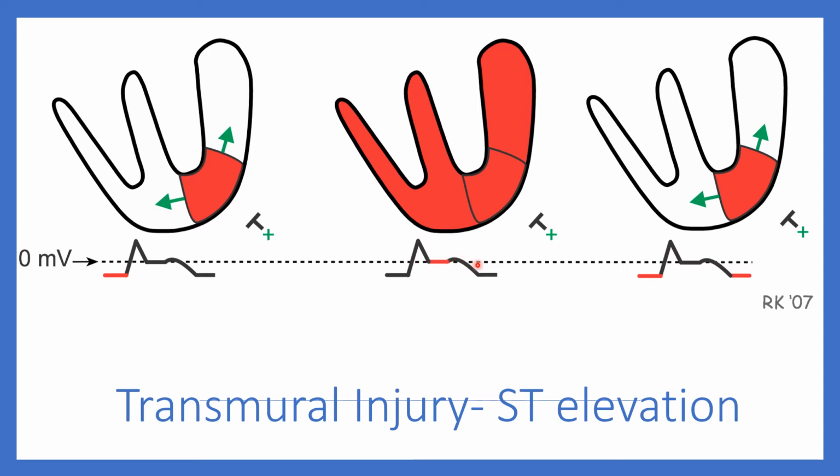When the repolarization is complete, you come back to the baseline, which is the PR segment again, that is below the baseline, and therefore you get this EKG abnormality that looks like the ST segment is elevated when in fact the baseline PR segment could be depressed, giving you this appearance of an ST segment elevation.